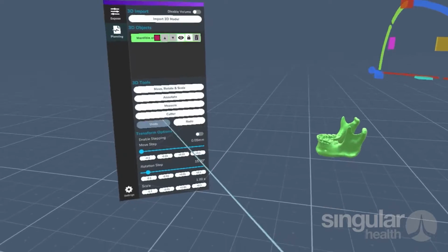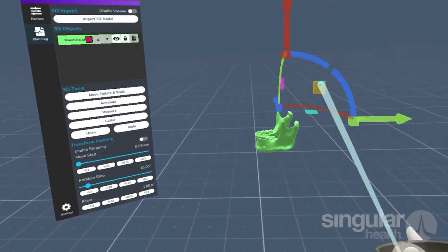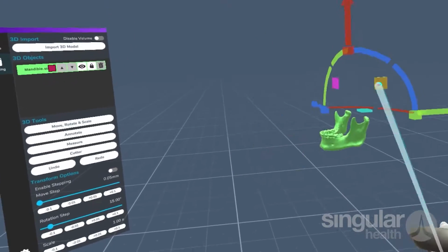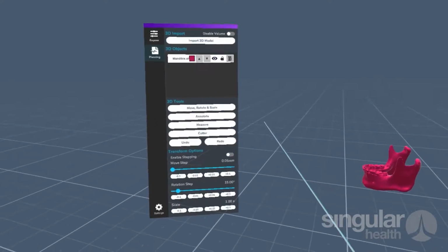All the tools have the undo function as well, so it lets us go ahead and undo, and it will reset our pivot for us. If we move it around and decide we don't want to, we can simply undo it, and it brings it back for us.